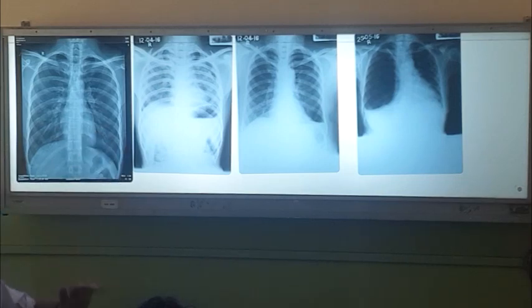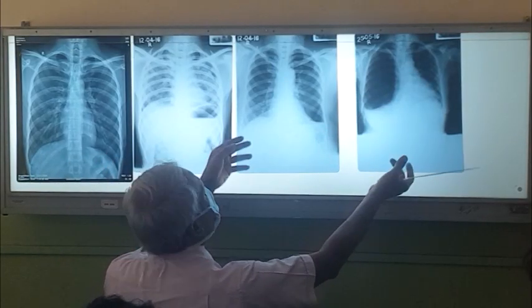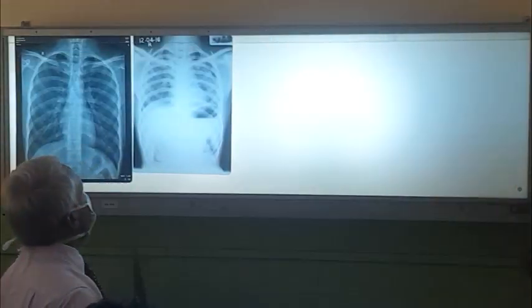You get a severe bronchopleural fistula and he is going to die, right? Whereas if it's a big pneumothorax, if you don't put an IC tube, he is also going to die, right? Sometimes you may have to do CT to differentiate, right?